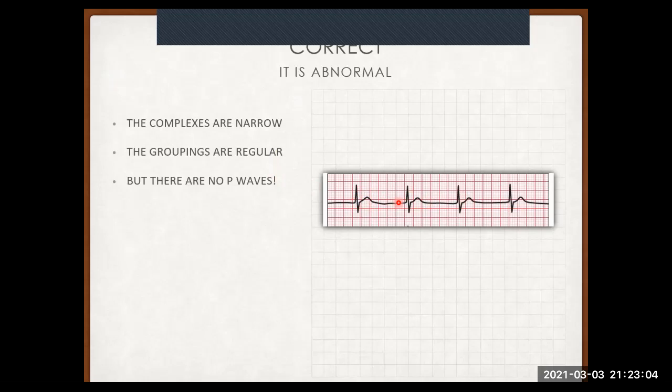Okay. So even though it looks normal, something's happened. Why isn't our atrium functioning? Now, because I'm speaking to most of you guys who are students who've asked for this, or maybe even new interns, when you see this and your patient is having symptoms, that means that even if you don't know the diagnosis, you know that something is wrong, which is the most important thing at your level. If you see something is wrong, don't be quiet. Take it up, go and ask somebody what's going on over here. Why is it that my patient has an abnormal rhythm strip? And let them make a decision as to what to do, which is all that's required.